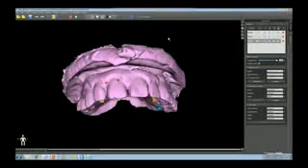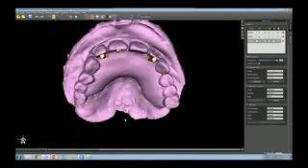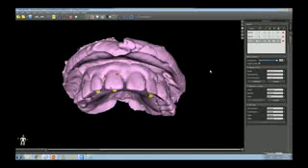So now we've done that. Again, there's some fine-tuning. I don't mean to let you think that it's done this quickly. There is a lot of fine-tuning to do when you do this. But these are the basic principles of how we do this in the different dimensions.